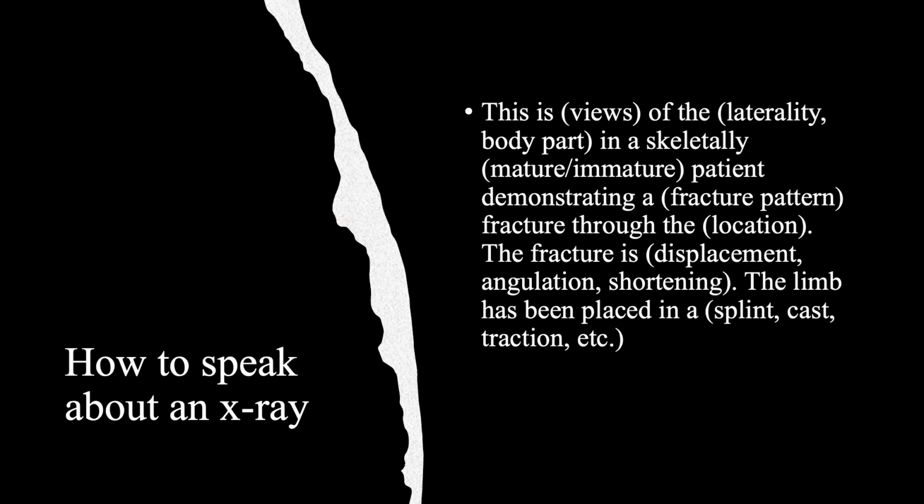So you see how the template can just be used over and over and over, but you're able to talk about the different X-rays that you're looking at. So if you go by this template and use this pattern, it will be a lot easier to not just speak about an X-ray, but make sure anyone who's trying to listen understands what you're saying in a way that they can visualize it.